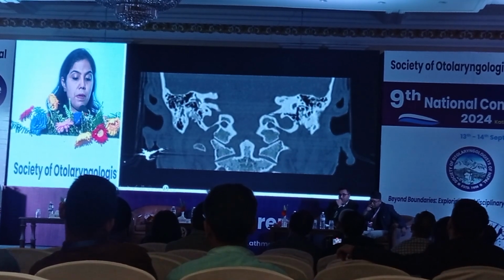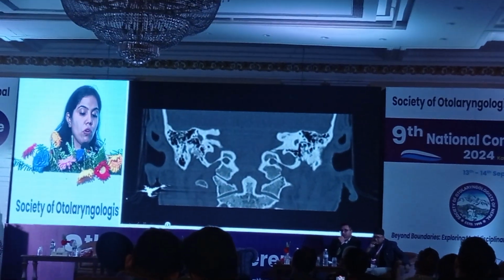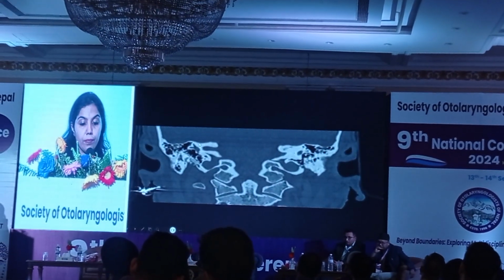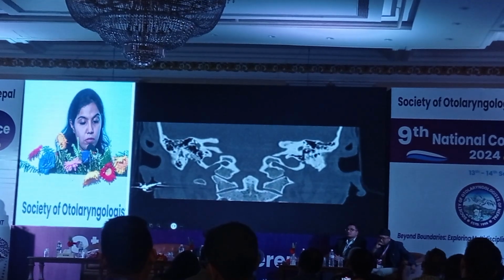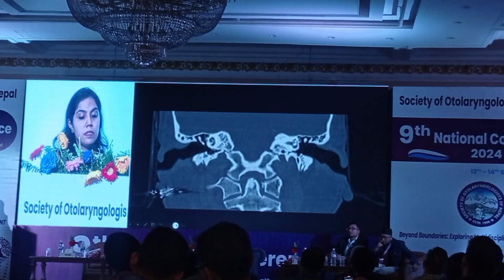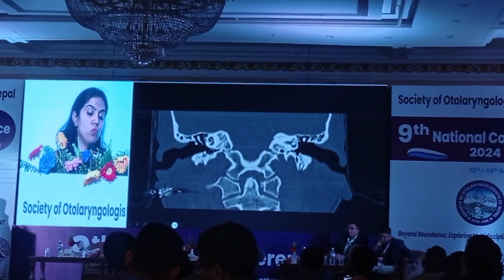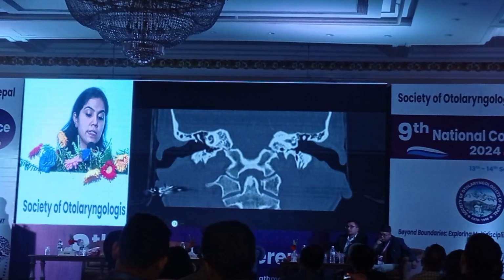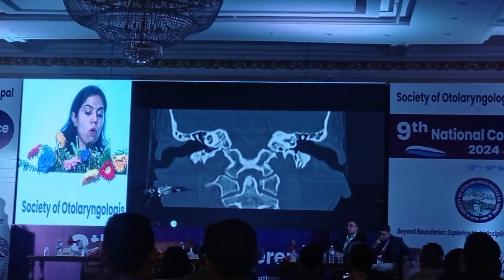And this is the appearance of my lateral semicircular canal. This dot is possibly a dot of facial nerve. This is again the appearance of the semicircular canals. This is my first ossicle, that is my malleus, and this bone is the scutum on the lateral wall, and its erosion is the first sign of the involvement of Prussak's space or cholesteatoma.